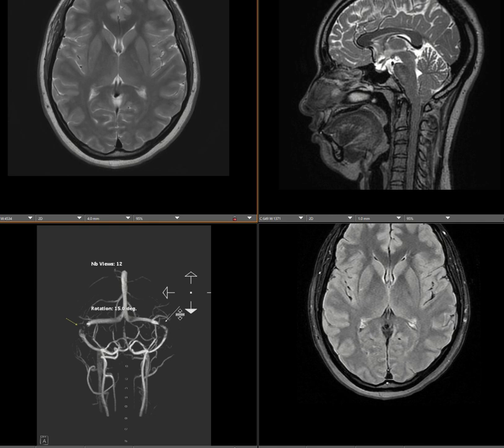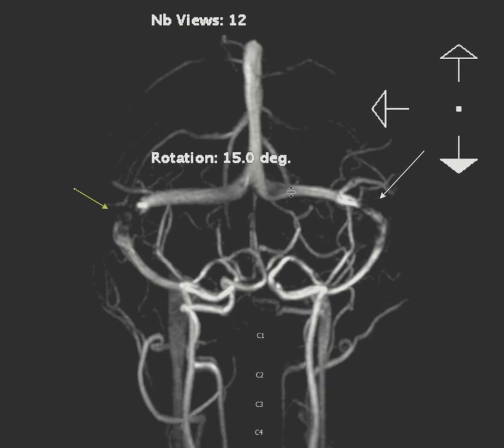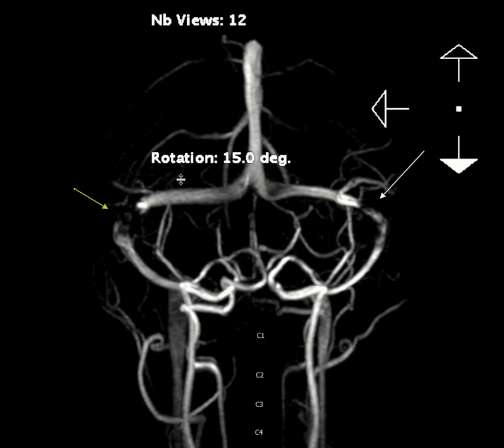And one of the most important imaging findings that we all need to be aware of is venous sinus stenosis. So basically, this is an MRV time of flight technique, so without contrast, and you see there is severe stenosis of the distal transverse sinus, and also the transverse sigmoid junction bilaterally. It's just worse on the other side.